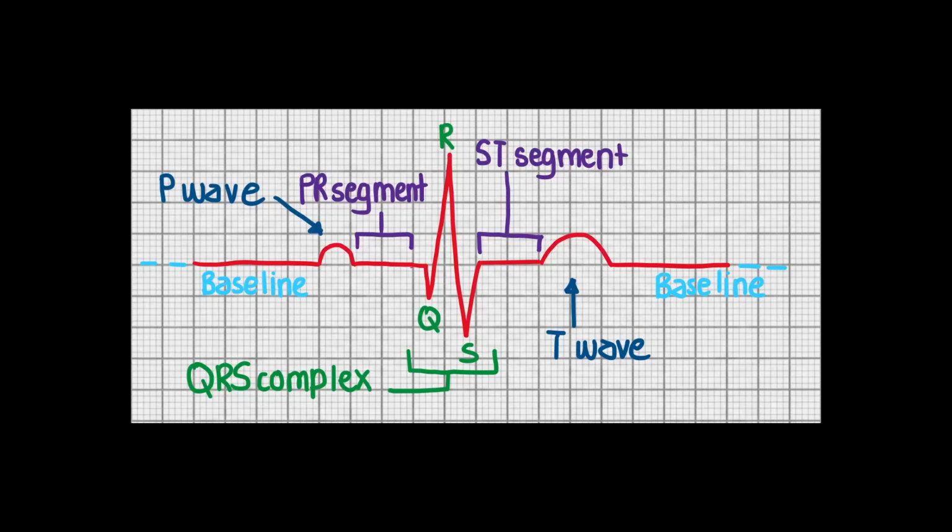In this video, we want to learn about the first wave in the ECG, the P wave.